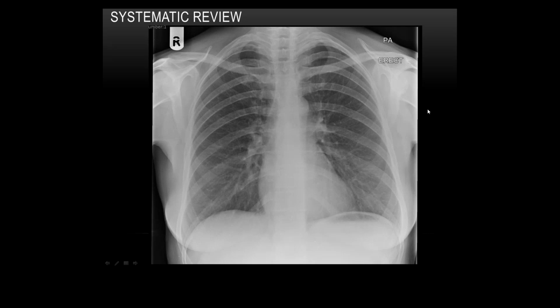You can open the CXR UniView and you can just have a day list and just flick through them all and just get your eyes on what's normal. And then you're going to have the reports there as well to back it up. So what I always advocate as well is don't look at the report straight away, because it kind of makes you biased to what you're looking at. Have a look at the chest X-ray first, try and make your own decision on it, and then use that report as reassurance that what you're thinking is accurate. And if it's not accurate, you learn from it.